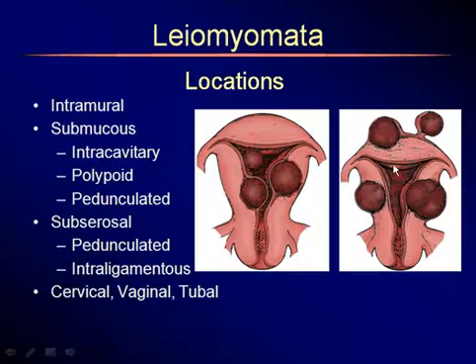Here are subserosal fibroids. So here's a fibroid that is more than 50% subserosal. The gynecologist will attempt this laparoscopically. They will not do hysteroscopic removal. And we can have a subserosal fibroid covered with serosa on a pedicle, on a stalk, so that's a pedunculated myoma.